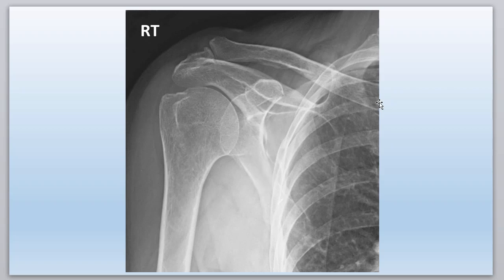Now, what's the structure right here curling around? That's a posterior rib. You can see that quite nicely. You can actually count them. Rib 1 is always strange and slopes downward. So you can always tell rib 1 is here, rib 2 is here, here's rib 3, rib 4, rib 5, rib 6, rib 7. All these kind of weird cotton candy-like structures right here are all the lung tissue itself.